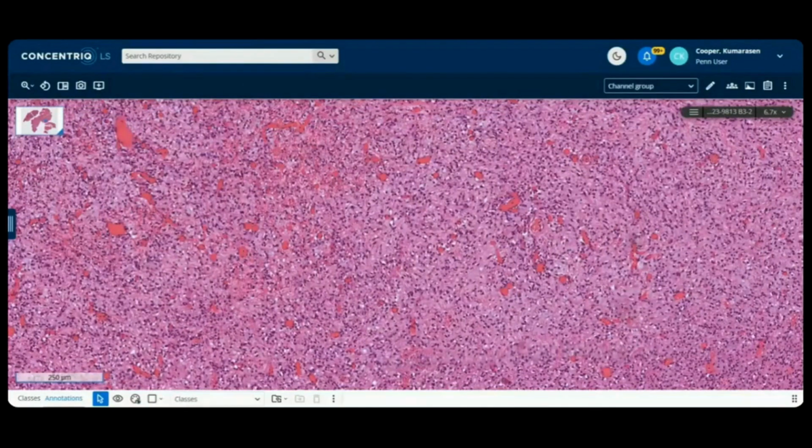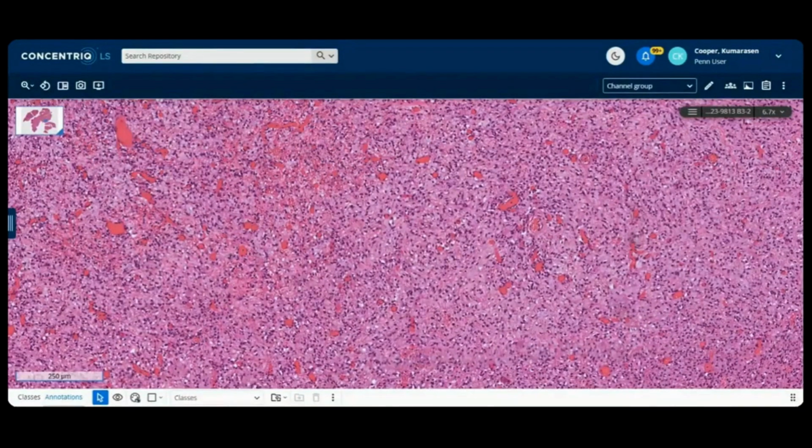But that's the usual, what was in the neck, soft tissue in the neck. Myoepithelial carcinoma, yeah, you have to rule out. That would require, like we discussed earlier, epithelial markers and myoid markers, my favorite being SMA and calponin, epithelial, EMA, and keratin. This is keratin negative, EMA negative, but CD34 positive, S100 negative.